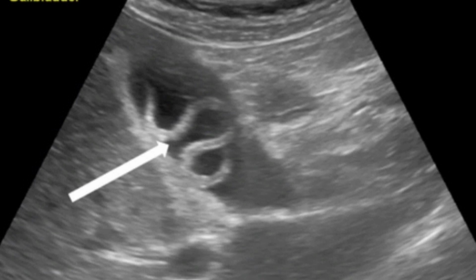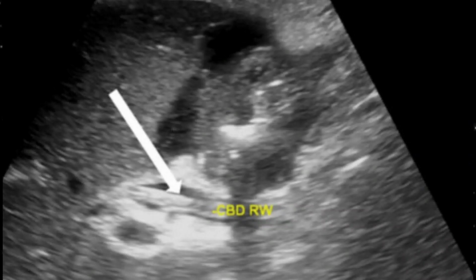Another important investigation, especially in Asian countries, is ascariasis. This worm you can see very clearly within the lumen of the gallbladder, and sometimes you can appreciate this within the CBD. Here you can see linear echogenic shadowing within the lumen of the CBD, and the CBD is also dilated. So now how will you write the report and document all these findings?